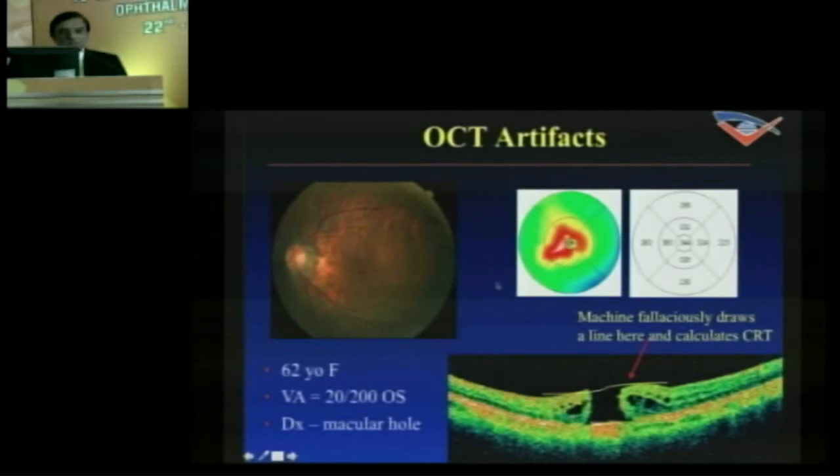And look at this picture. You have a patient with a macular hole, but the volume scan shows there's a macular edema. So that can't be correct. Obviously, because when the machine is plotting, it takes its marker here and thinks of it as an edematous area when actually there should not be any thickness.